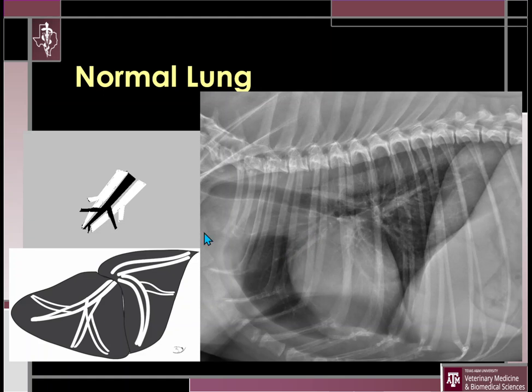medially located. So if we pretend like these are the lungs, these white linear structures are going to be the vasculature that goes and branches into the various lung lobes, and then we have air-filled structures around it, as well as the bronchus between the vessels. So illustrating the same thing, the pulmonary artery, the bronchus, and the vein with air surrounding it.